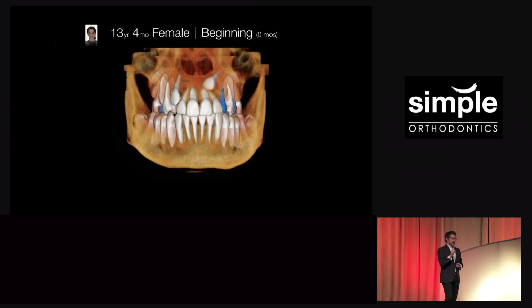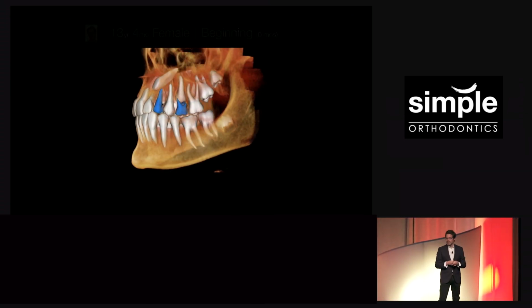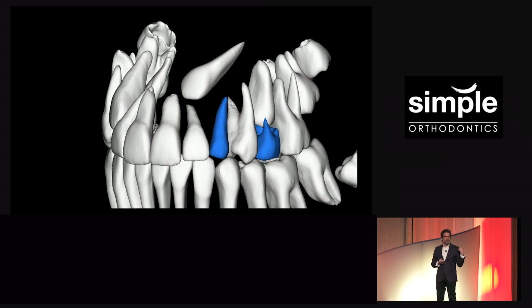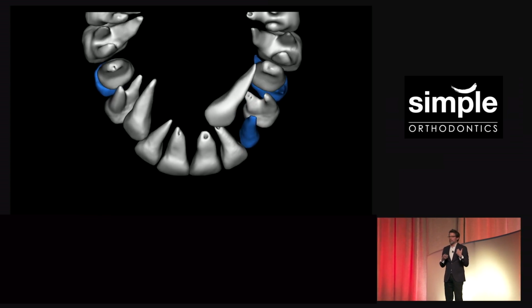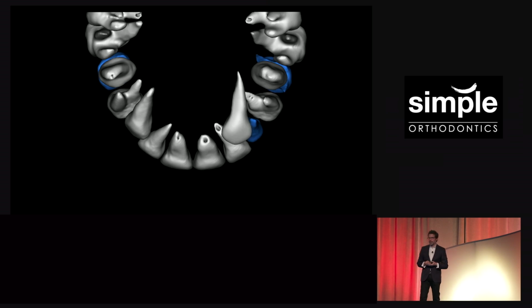So what we do in treatment planning is we design the plan, which you're going to see on this movie, and I send this plan to the surgeon digitally, right? So now I'm communicating through wires all the time. I don't need to take the models and show them all these things. I send the plan over and tell them, here's how I'm moving the tooth.